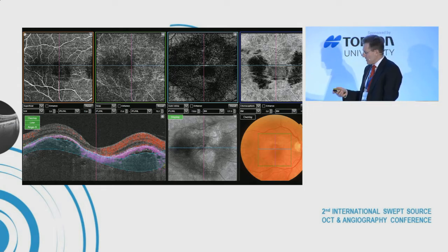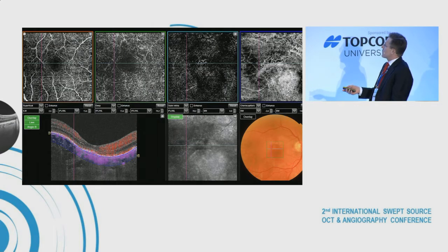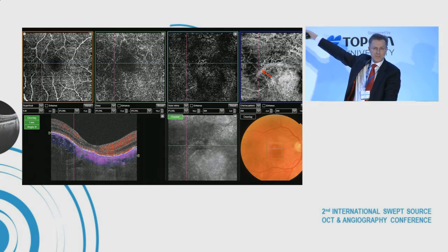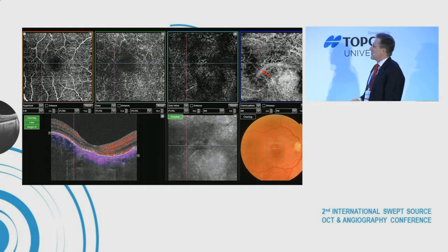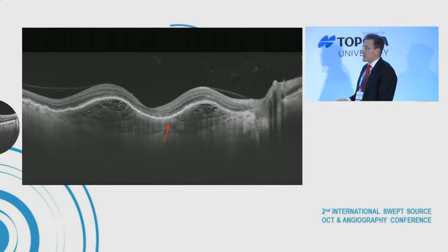And what you see here, down below to the left, is the noise signal from flowing blood, and corresponding with that, up there to the right, we have a monster CNV vessel, the biggest I have ever seen, and it was actually already there on the structural OCT, though I didn't realize it, namely right here.